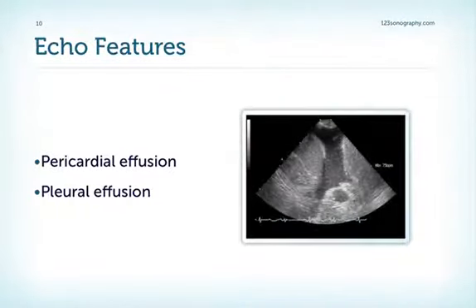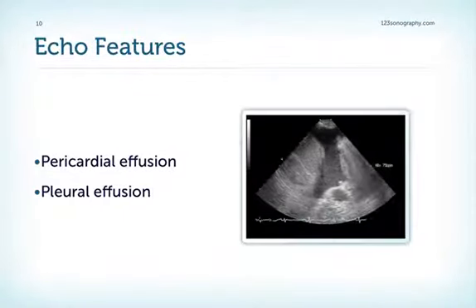Usually pericardial and pleural effusions mark a more advanced stage of the disease and seem to be associated with a poorer prognosis. In general, patients with amyloidosis have very good image quality simply because they have such an echogenic myocardium and because of the pericardial effusion. So you will see these patients very often also at various presentations or in covers of textbooks.